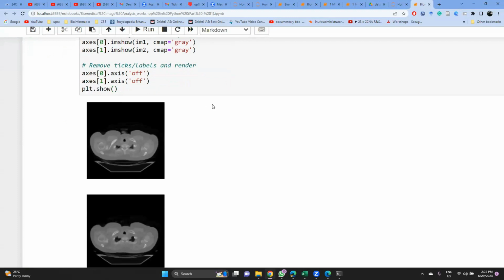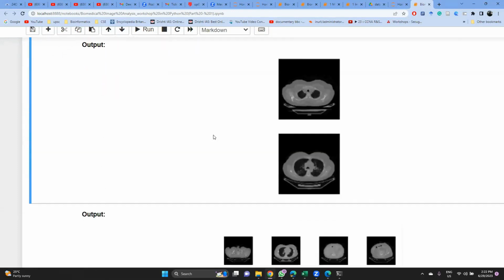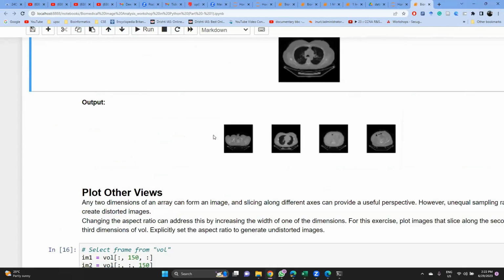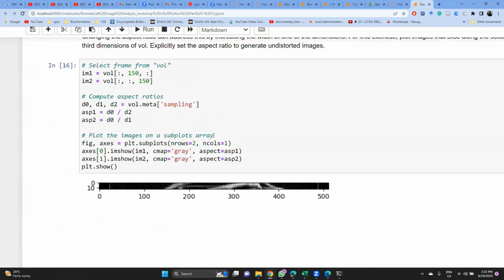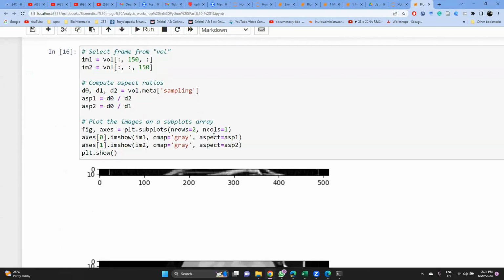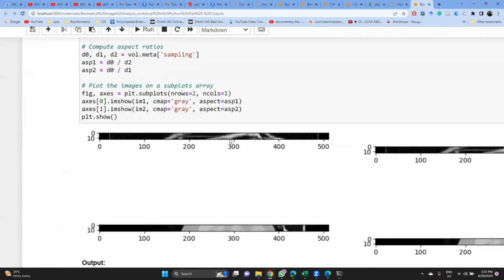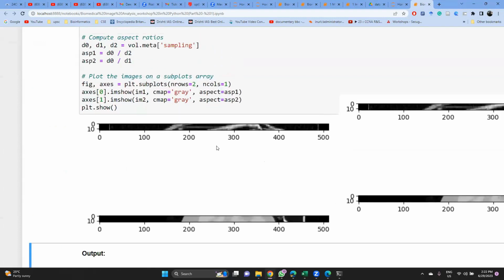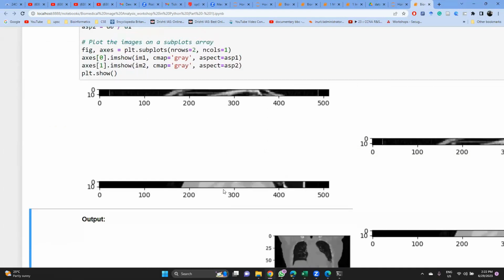it is showing the x-axis and y-axis. So it is giving us the particular output for that image. Now, if we have to look for the sliced or other views, just as if we want to look for the smallest part and trace it out for our research work, or we want to look at a particular part within our image, then we select a particular part over here, and then we can enter, and it's showing us a sliced window of that particular image.